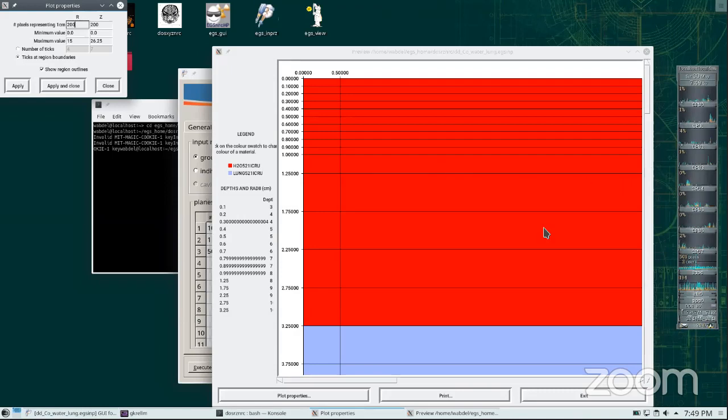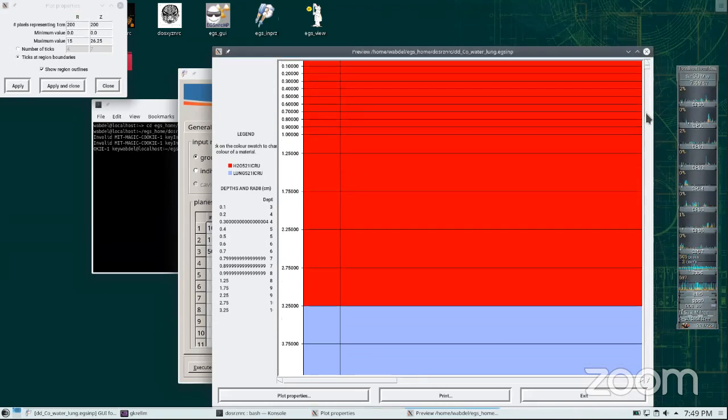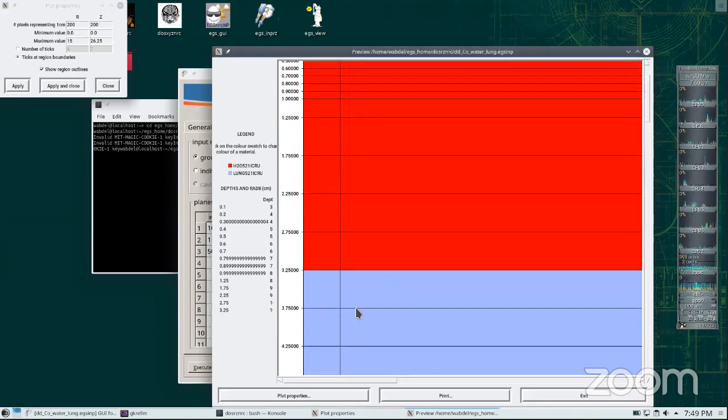And then, here, for example, if I said we need to be at 3 centimeters, this is not correct. I forgot what's in the question. But if we need to actually start from 3 centimeters, then this boundary should be at 3 centimeters. So we need to fix that. We need to probably remove this or adjust something, but at least now I know, for example, that region 16 is actually very close to what I am. So these are going to be, I think, 10, 11, 12, 13, 14, 15. So we're starting at 16.